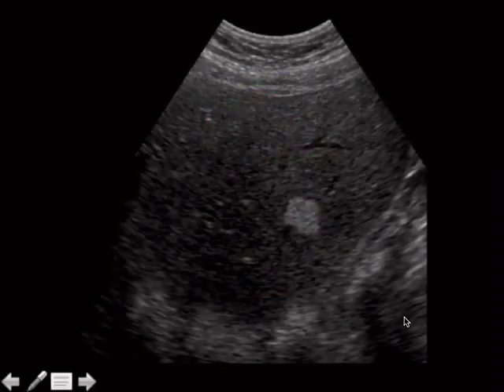All right, ultrasound case. So we've got a hyperechoic lesion in the liver. And probably everyone who's looking at this is going, it's a hemangioma case. It's always hyperechoic lesion equals hemangioma. I'm here to tell you that you've got to be careful with that, in real life and on tests too. Because a hyperechoic lesion in the liver means very little. That could be a met, that could be a cancer, that could be anything. Yes, hemangiomas are common, but that is not at all a specific imaging finding, because it's hyperechoic relative to the liver parenchyma, and the liver parenchyma can be all kinds of different.